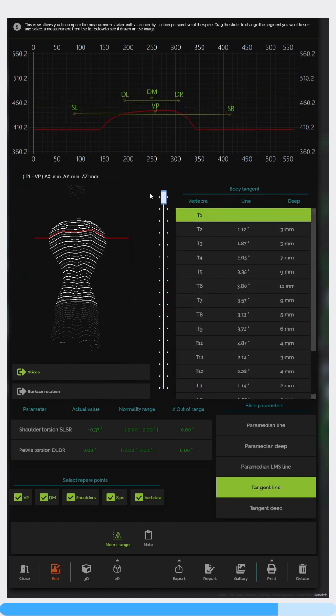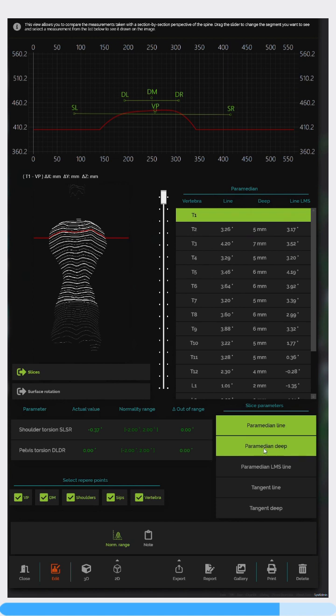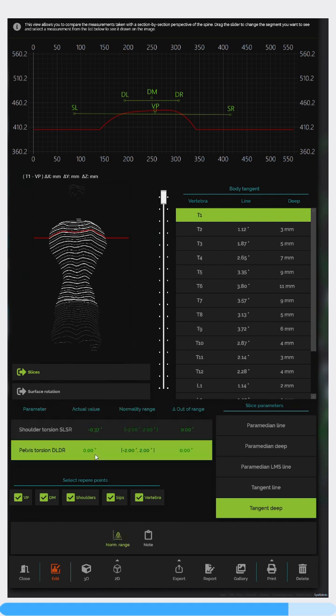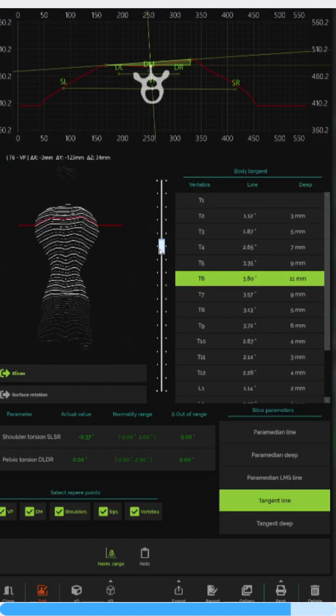And so there is a mild amount of rotation, only 3 or 4 degrees. And we can look at this from various different angles. Again, showing the normative values, which are within a subtle range. Less than 5 degrees of rotation is okay. But this patient would really benefit from some mirror image adjusting in that thoracic spine and some rehabilitation, which is one-sided, really opening up and derotating that mid-thoracic spine, as well as possibly checking her for spinal cord tethering.